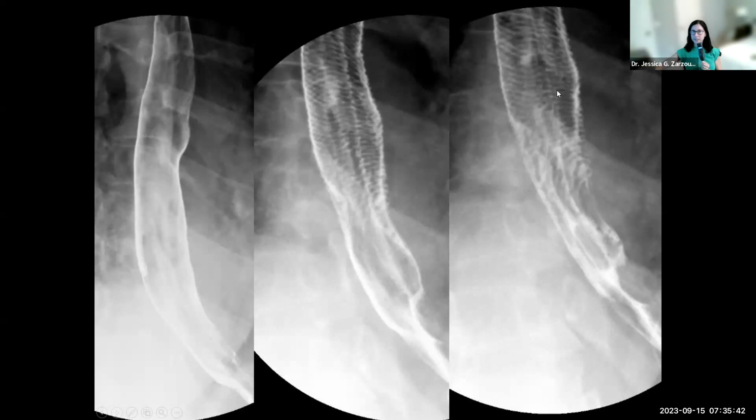And it's really insignificant other than just to know what it is so that you don't get it confused with something else that is more significant. But it occurs when there is gastroesophageal reflux. This is a reaction that the esophagus will have sometimes to that gastroesophageal reflux, but it's transient. So that's the important thing here. So 1 minute it looks normal. The next minute you can see these transverse folds, feline esophagus, and then the next minute is back to normal again. So it's just occurring during those episodes of gastroesophageal reflux.